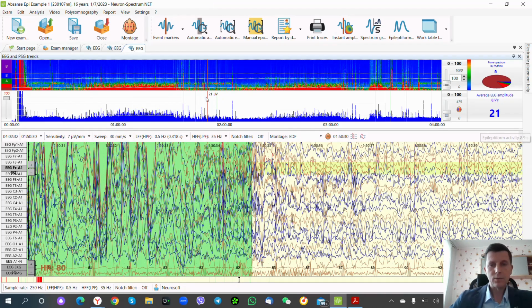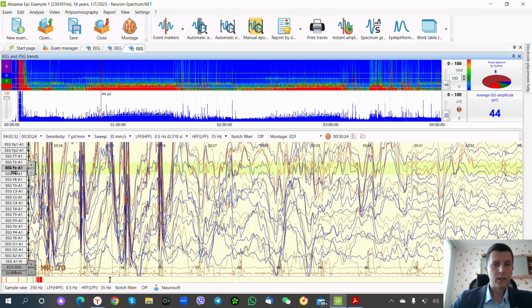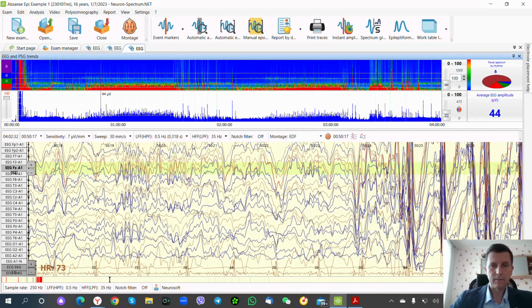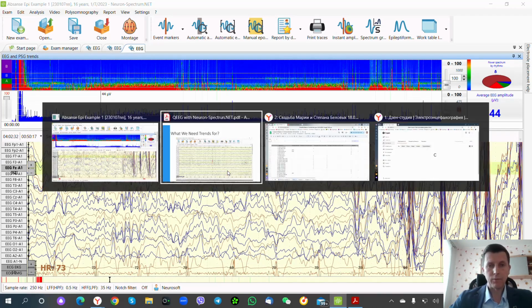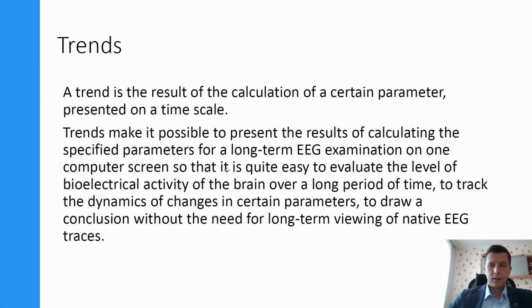It is very easy to see all the EEG recording. For example, here it is a 4 hour recording. We can see all this recording here on only one screen. It is very helpful. So, I already told what trends are.